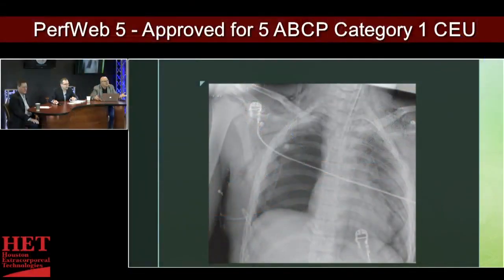So this one is a good film. This shows a lot of different things. If you look at the bony structures, they all appear relatively intact. I don't see any bad fractures or anything like that. So let's move on to the soft tissues here. What you can see here is subcutaneous air and emphysema. These lighter areas within where the latissimus and the chest wall are is subcutaneous air, emphysema.